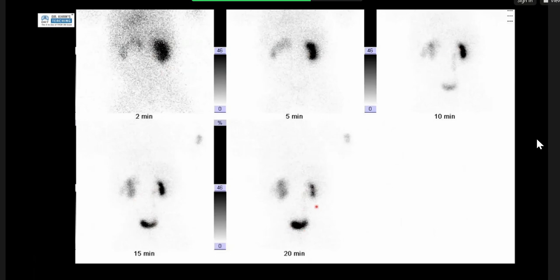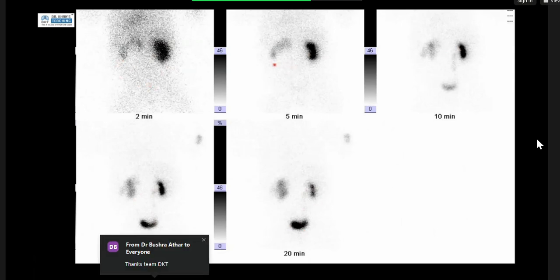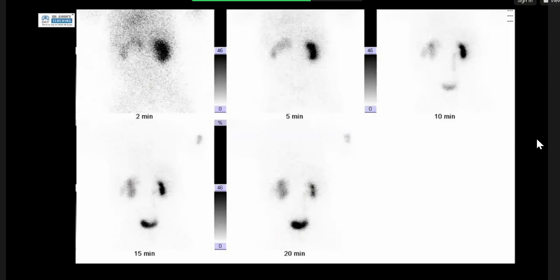And then this is delayed uptake into the left kidney. So you can see that you're not really getting uptake until about 15-20 minutes throughout that kidney with no excretion going into the bladder. So sorry for confusing everyone there. But that is clarification. So the left kidney was abnormal on that MAG3 study, which fit in with the curves that we were seeing.